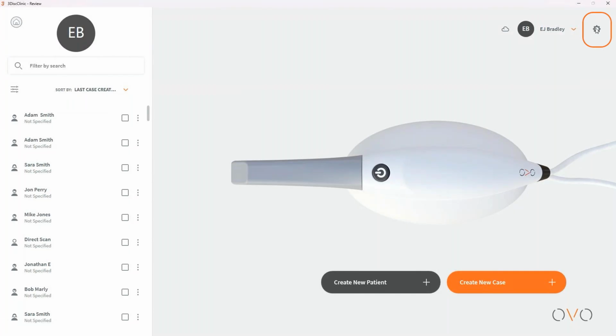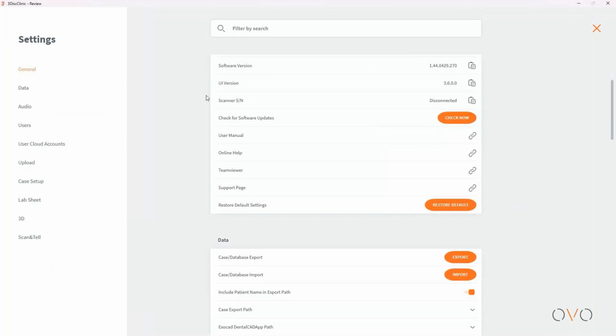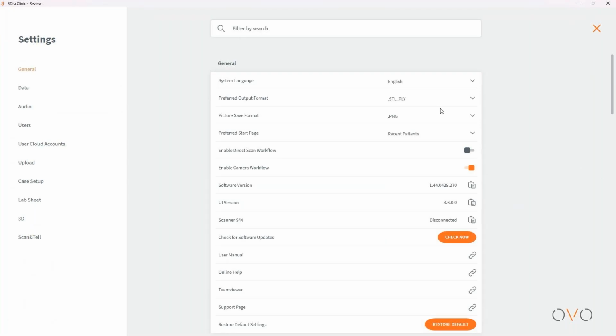I'm going to go ahead and click here with the left click on my mouse, and you'll see a lineup of options here on the left-hand side. It starts with general, and then we can scroll down. As you see, database or data right there aligns with data here. So you can just click over here on the left-hand side to get where you want to go very quickly, or we can just use our mouse wheel to scroll down.